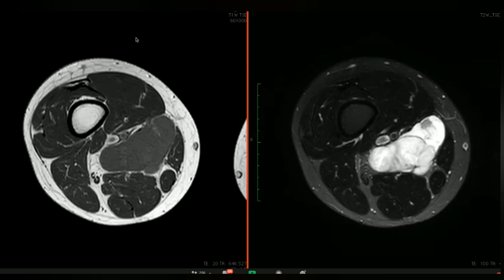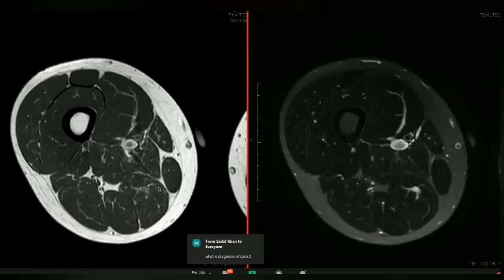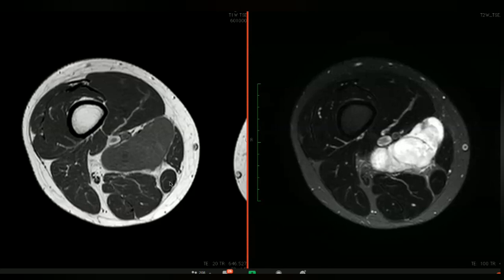How would you approach this? What would be your approach? Would you approach it from the anterior compartment going through the vastus medialis? Would you approach it through the gracilis? Sorry, this is sartorius, that's the gracilis. So would you approach it through the sartorius, or would you go through the hamstring compartment? Where would your needle go? Anterior, medial, lateral, or posterior? Sir, most likely medial. Why? Through the medial compartment, without interrupting any vasculature or vessels.